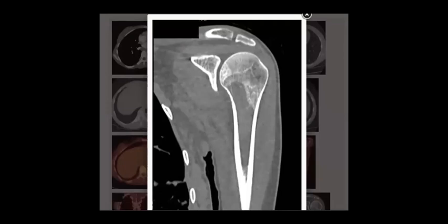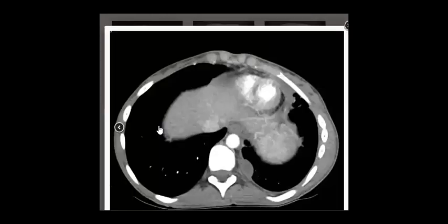So if we focus on metastasis, what will be the primary? Perfect. It can be bronchogenic, it can be breast metastasis, one of the most common.